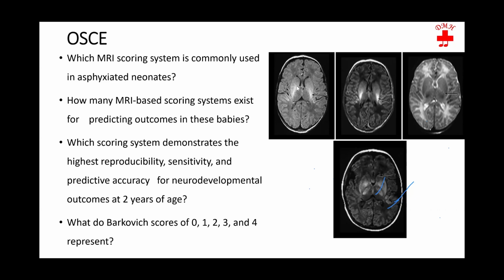Okay. And ideally, gray matter is gray and white matter is white, so the brain looks like a proper brain. However, because of the myelination problem here, the gray matter would appear white and the white matter would appear gray. So this is T1, and exactly the reverse happens in T2. Okay. And the FLAIR sequence is exactly like T2, but the CSF is black. That is how you differentiate.